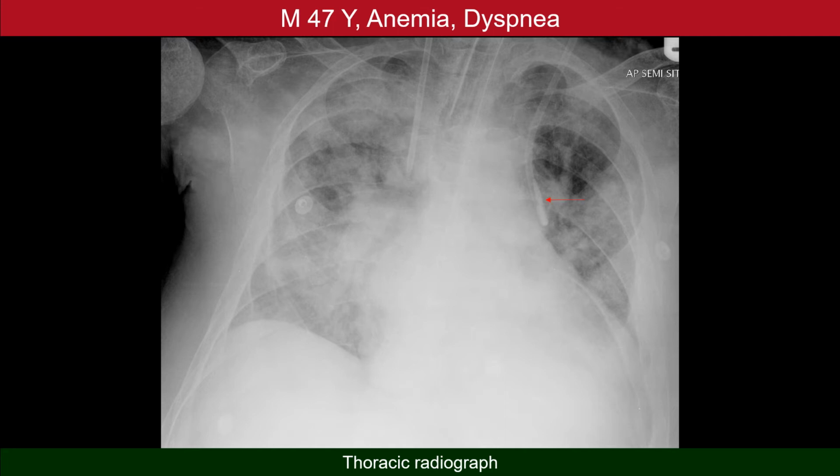Observation 8, and probably the most important and the most interesting of all, is a catheter in a bizarre location at the left side of the mediastinum. This is presumably a left central venous line that has lost its way instead of crossing from left to right in the left innominate vein. It has gone vertically downwards, probably into an anomalous vascular structure on the left side of the mediastinum.